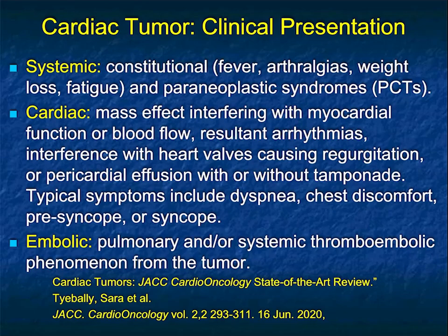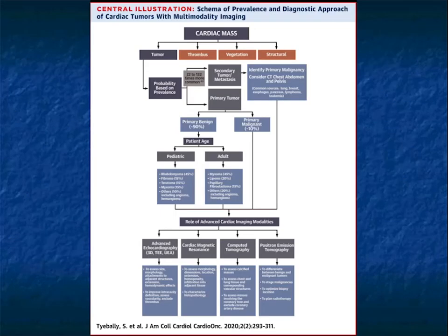We also could think about things that look like a tumor, like a pulmonary artery sarcoma. That's maybe not a cardiac tumor, but it's one of the key tumors in the heart, but arising in the pulmonary artery. So again, something to think about.